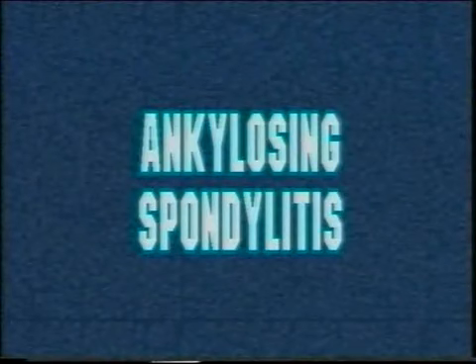Ankylosing spondylitis. This X-ray shows a typical lumbar spine in early phase of ankylosing spondylitis. The vertebrae are square with loss of superior and inferior lips of the vertebral bodies, and then the interspinous ligaments are calcified. Here you see the calcification of the anterior spinal ligament. This is the beginning of the formation of a bamboo spine. The earliest changes, of course, are seen in the sacroiliac joints.